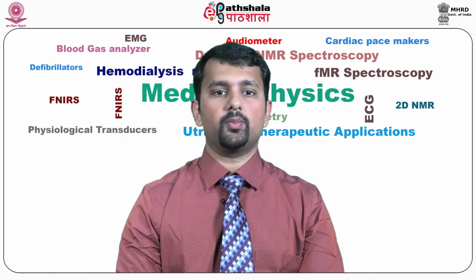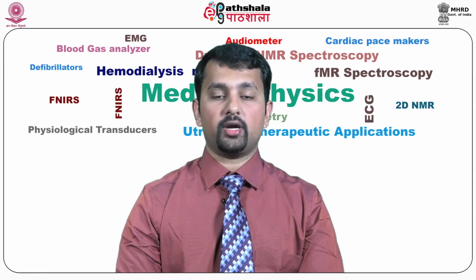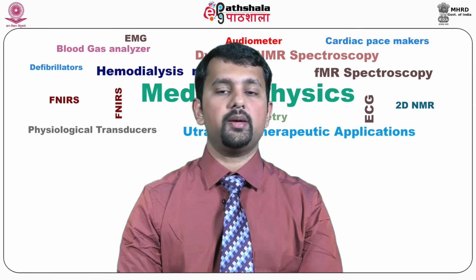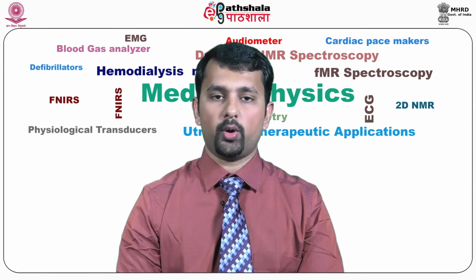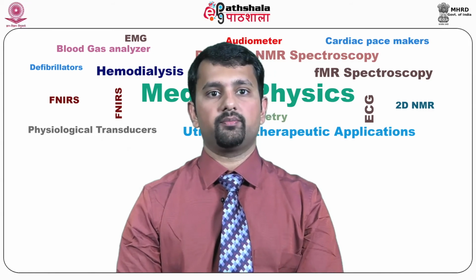Proton MR spectroscopy is effective for quantification of liver fat. The lipid triglyceride spectrum consists of multiple peaks representing CH3, CH2 at 1.3 ppm, CH2 at 2.2 ppm, and CH at 5.3 ppm lipids.